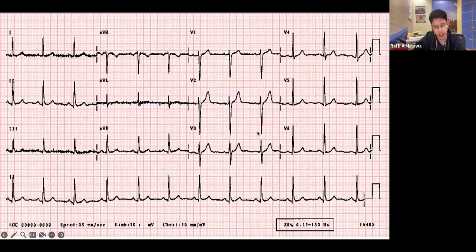Okay, let me show you guys how you should interpret this. So the first thing you need to do, and in the hospital, obviously you identify the patient. This is their EKG. It was ordered for whatever reason, and then you start. So you look and you try to determine the rate. The machine will mostly do that for you. So you look at 1, 2, 3, sorry, 4 big boxes, not 5 big boxes. So there's 4 big boxes between the QRSs, and they look regular. So rate and rhythm: 4 big boxes means 75 beats per minute, and I know that it looks regular.